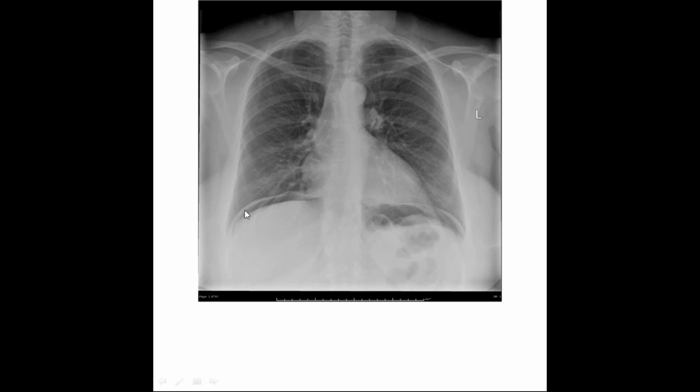So that is why I had put forward this X-ray, that sometimes on an X-ray you may pick up things which are not what you ordered it for. For pneumoperitoneum, the investigation of choice is definitely chest X-ray, but sometimes you may have ordered a chest X-ray for something else and you may find out that there is air under the right diaphragm. Okay, let's suppose I would say that this is not a pneumoperitoneum. What else would it be?